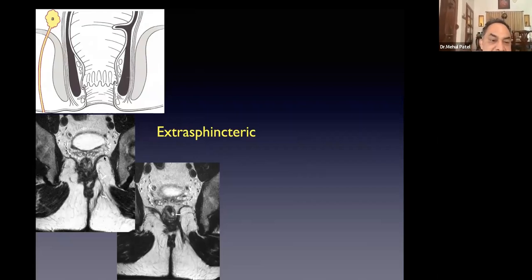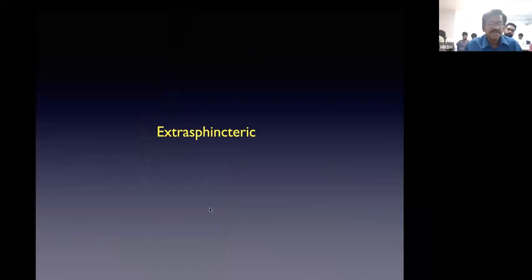For the anatomy, this is the ischianal fossa. This is the external sphincter going up as the levator plate. The grayer inside muscle is the internal sphincter. And the white in between these two is the intersphincteric fat, because fat is white. Now, when we do the fat suppress sequence, all this white will become black.